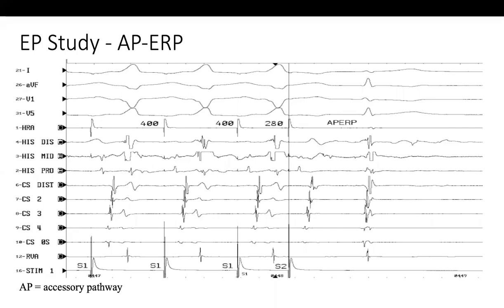This is just a simulation of what we are talking about. We are simulating the stress on the accessory pathway by reducing the S1 to S2 gradually, until we cannot conduct anymore through the accessory pathway, so the conduction is carried through the AV node only.